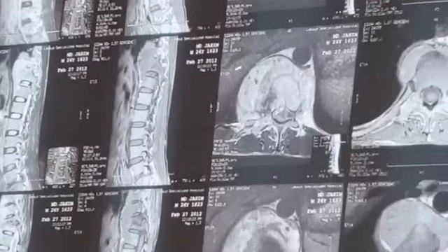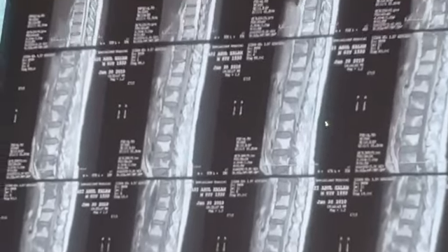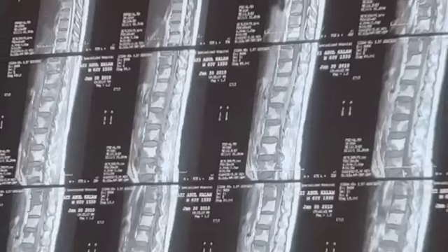Can we see? Outside the vertebra, there is a huge collection of fluid. This is a perivertebral abscess, also known as cold abscess. Right. This one, we can see multiple lesions of the vertebra involving the spinal cord as well. These are multiple metastases of the spine, dorsal spine.